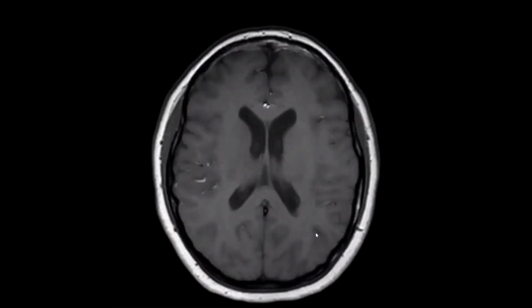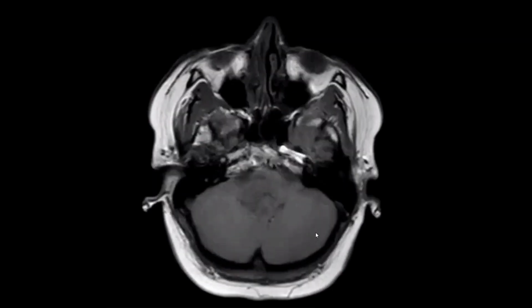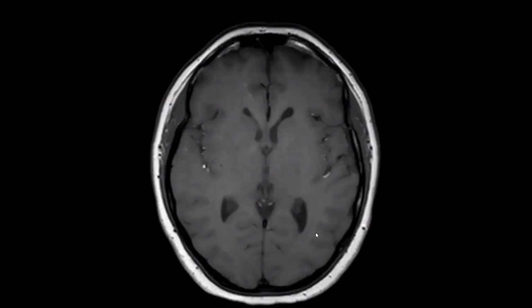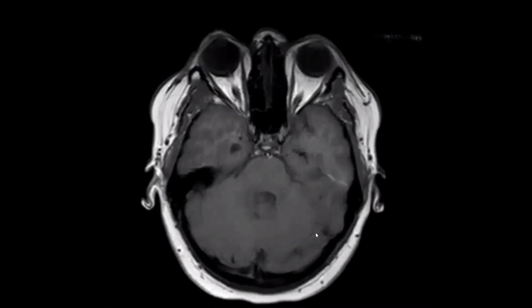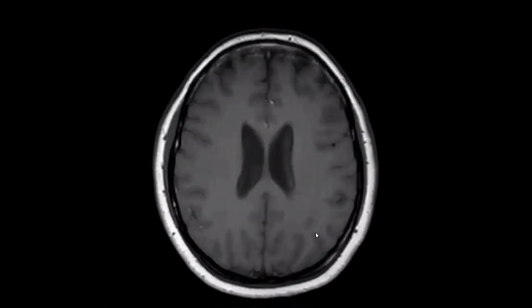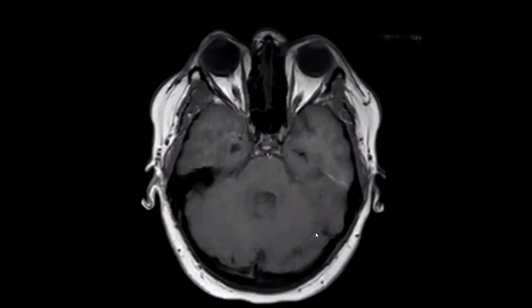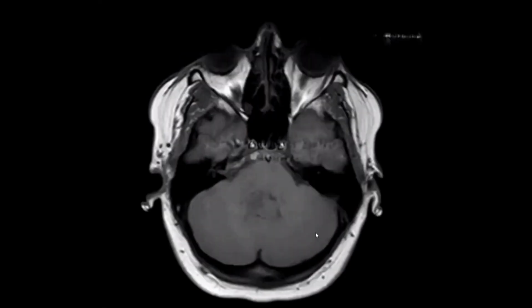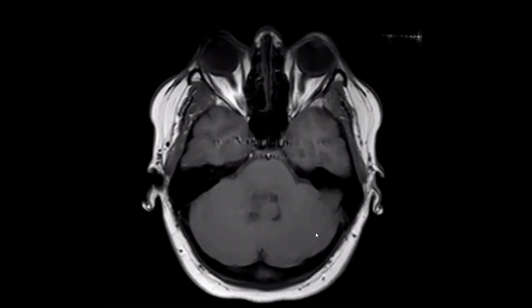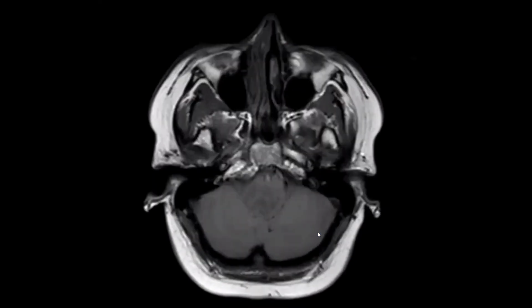Okay. What is the patient history? Headache only. Okay. I've been provided with axial cut MRI brain T1 images. I will have a look and then comment from upward to downward. I can see that there is abnormal hypointense signal noted within the fourth ventricle. Yes, agree. We have something abnormal inside the inferior part of the fourth ventricle.